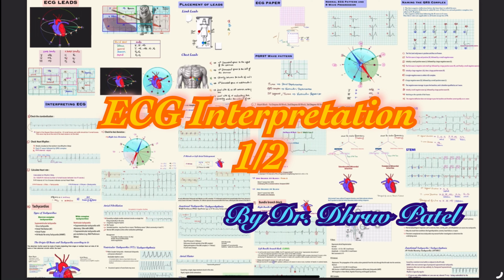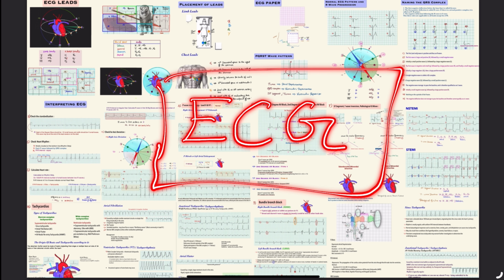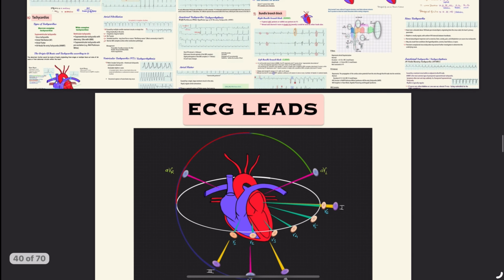Today we are going to learn one of the most important topics in cardiology, the electrocardiogram or ECG. First, we will start with an overview of ECG leads.